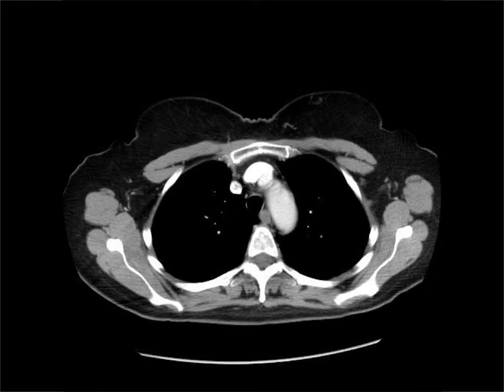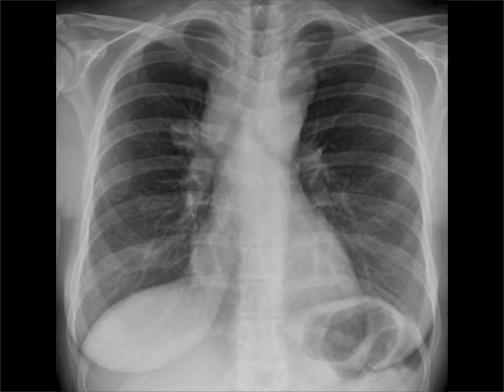The only thing that we do see there are these little grey ovals, and those are normal lymph nodes. If ever we see little oval grey things, they're usually lymph nodes. So they're normal right paratracheal lymph nodes, and that's why we pay attention to anything that can produce enlargement of lymph nodes. Some examples in the thorax would be lung cancer, lymphoma, sarcoidosis, metastatic cancer of any type, which can all enlarge those lymph nodes. So that's why we pay attention to the right paratracheal stripe. Now let's see some examples of this.